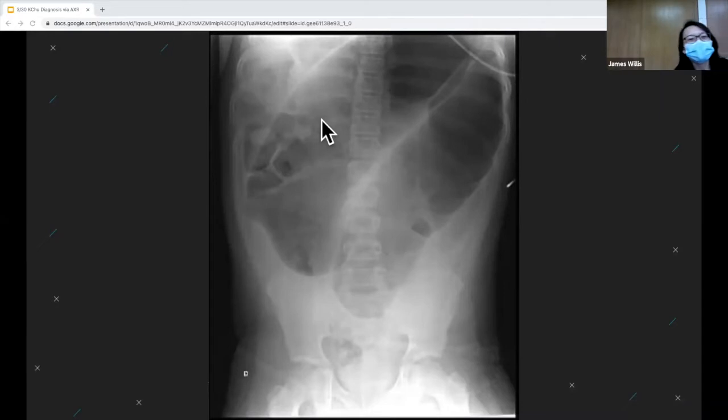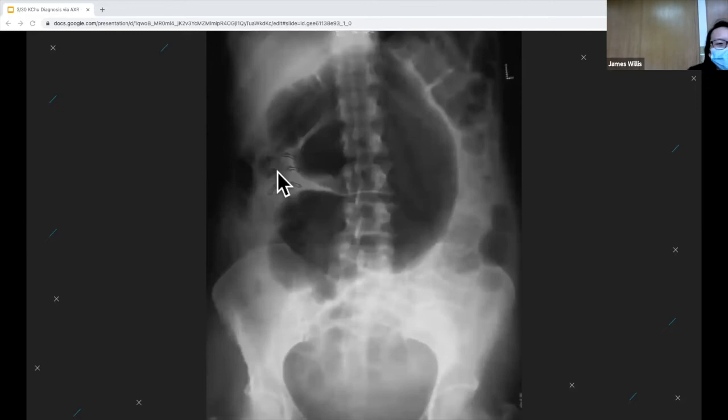Yeah, you have a classic coffee bean sign and diagnosis. Yeah, so with the sigmoid volvulus, the next step is to get GI to decompress. Great. Jamie?